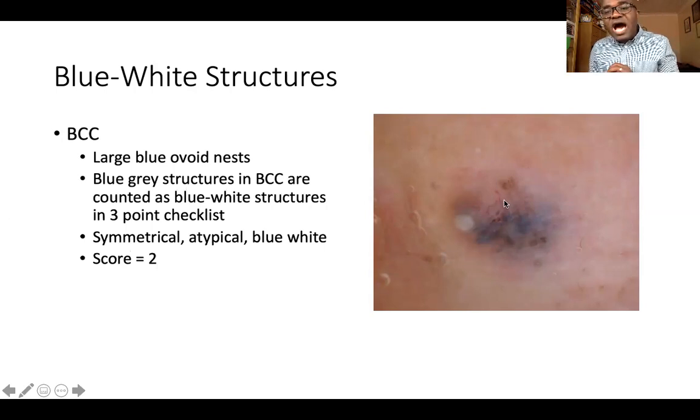But if you add all the other dermoscopic features, which you will learn about later for BCC, it will tell you specifically what you're looking at. It's got some arborizing blood vessels over there, and you can also see the leaf-like projections on the edges, and blue-white globules. There might be some micro ulcerations there. This tells you that this is a BCC you're dealing with.